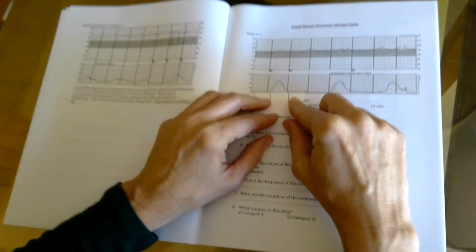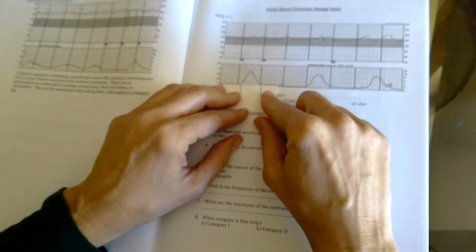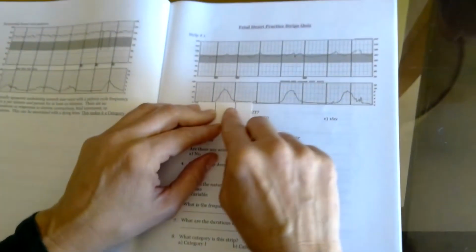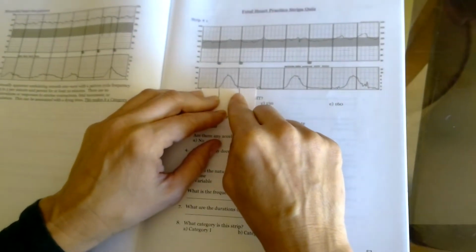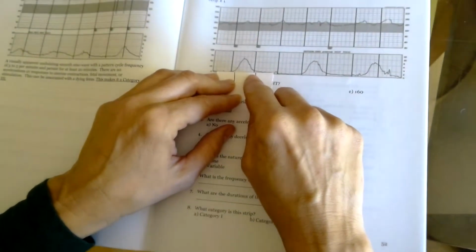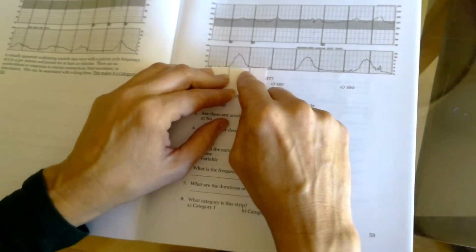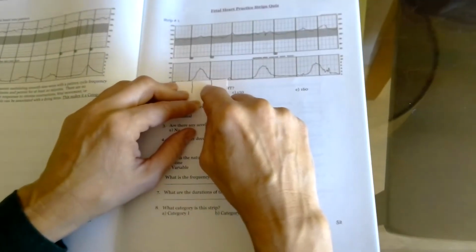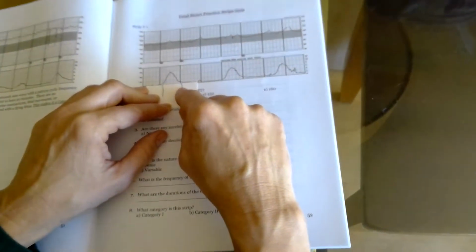So you're going to go on ahead and put the first line right where this contraction is starting. And we can see here where the second line is. The contraction's probably been over for about 10 seconds. Most of the energy of that contraction's pretty much over. So I'm going to go on ahead and just minus one box here. I'm going to call this contraction about 50 seconds.